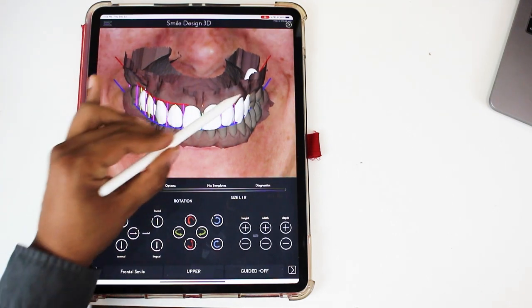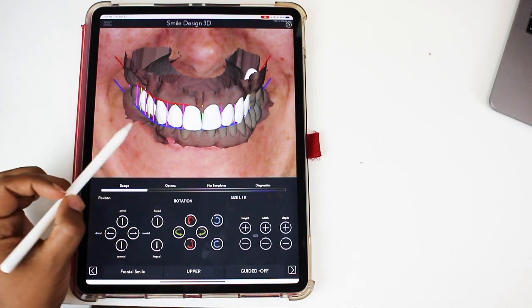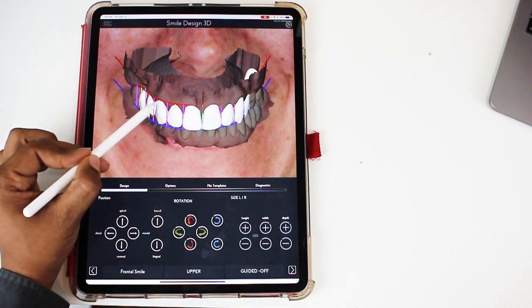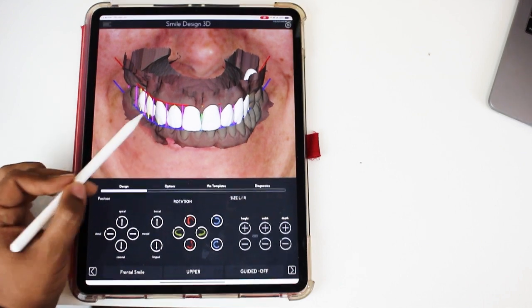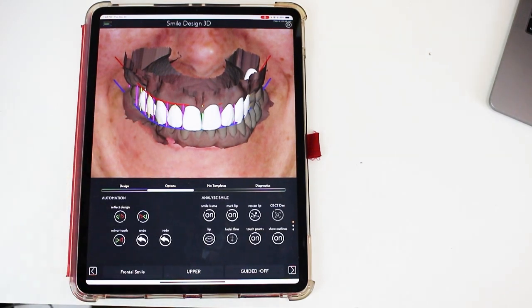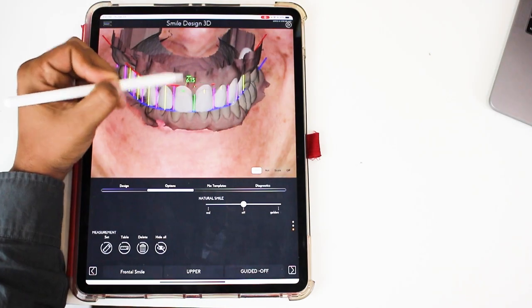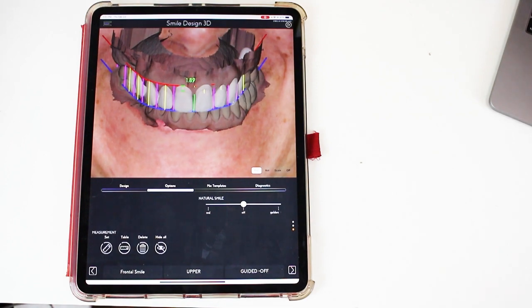In my perio analysis, I used a perio probe, numbed the patient, and did the measurements from the bone crest to the CEJ and from the CEJ to the border of the cervical margin. And I can use those measurements that I did manually and apply them into my design to make sure that I have an accurate 3D gingivectomy guide. And with a ruler, you can confirm the measurement that you did on the patient's mouth.